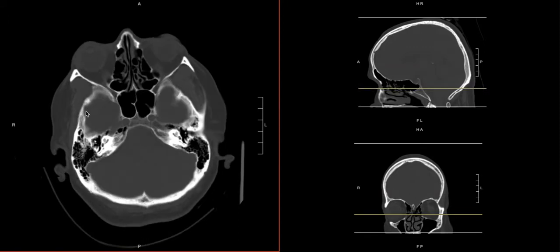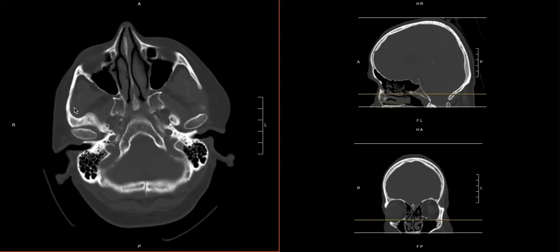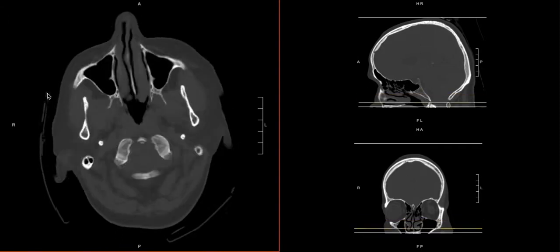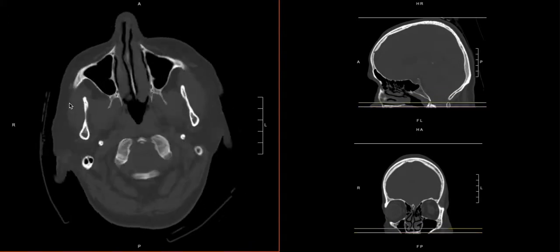This is the squamosal portion of the temporal bone. We can come down looking for any fractures that might be here. And then also, we don't want to forget the zygomatic arch here. It can be a common place for fractures. So we're just looking all around very systematically for fractures. Here we have the ramus of the mandible. We catch that on our scan, so we'll look there as well.